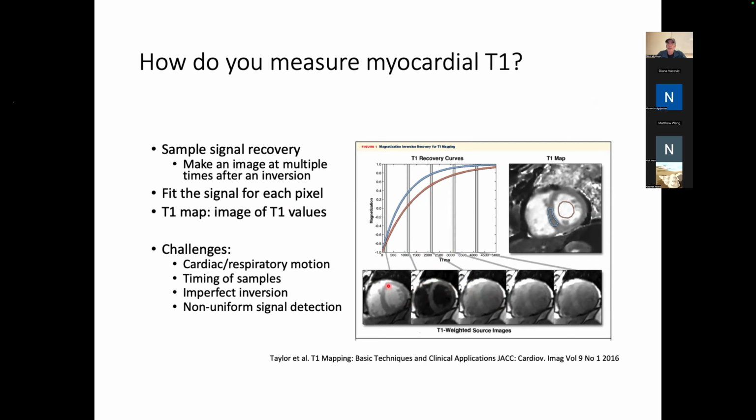So now we've got, for each voxel, we can plot this curve, right? And then you just fit it and you solve for the T1 value and then produce that as the T1 picture. And so here's our T1 map for the 5 images we've taken. We run a fit and we can plot it as a T1 map.